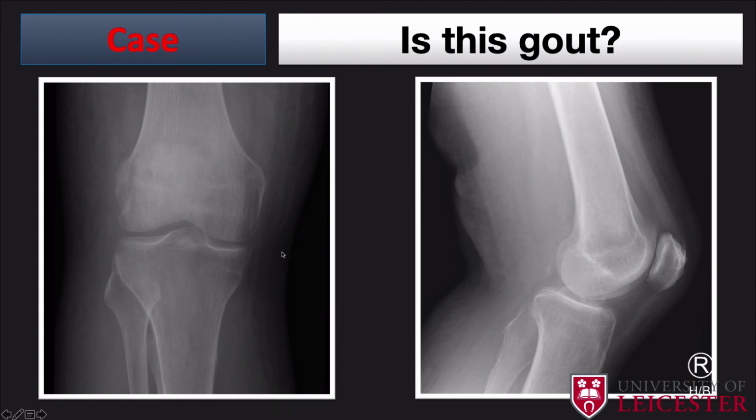So this is a middle-aged patient with knee pain and swelling, history of gout in the feet, and this patient has subcutaneous edema, including this very subtle thickening of the pre-patella soft tissues noted on the lateral radiograph.